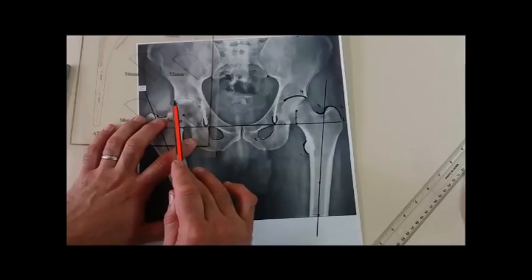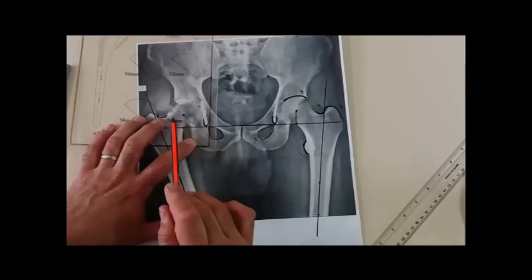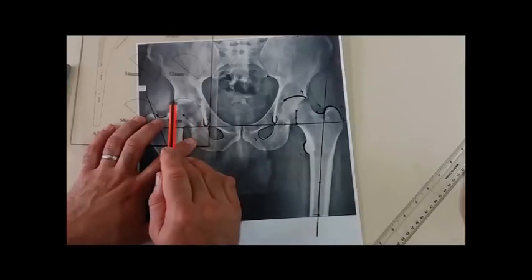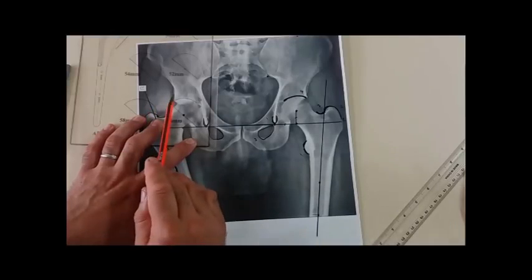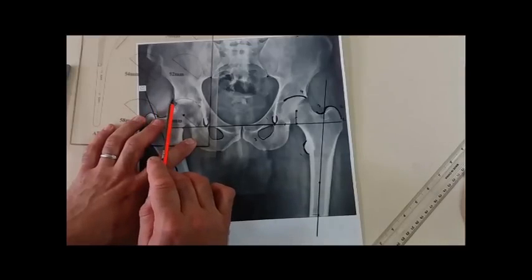How to deal with this uncoverage? If this uncoverage is less than 10% of the surface area of the whole cap, this is acceptable. But if it is more, for example, 20% of the acetabular outer surface area is uncovered, what to do? One option is to keep the superior osteophyte. Usually in some cases of osteoarthritis, we have some large osteophyte superiorly. While we're doing the arthrotomy, we should keep this osteophyte superiorly, which will aid in this coverage.